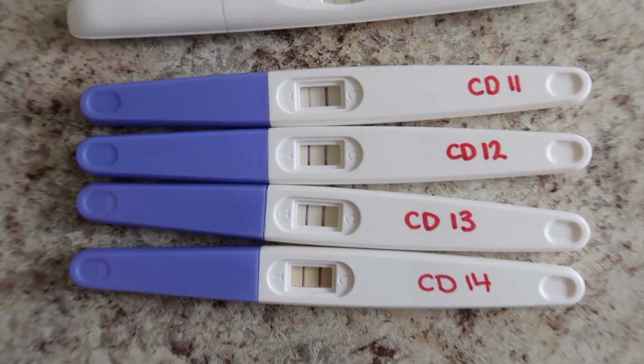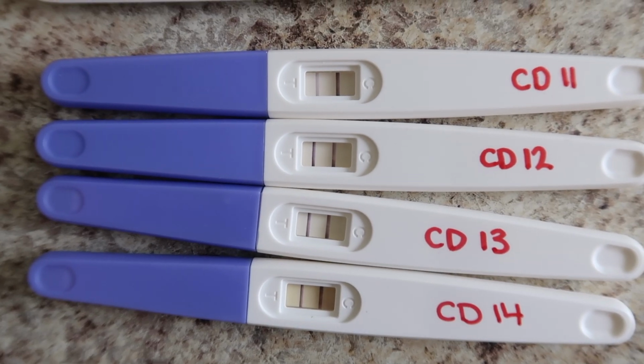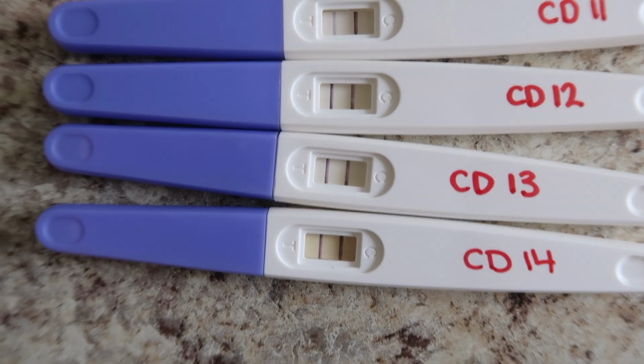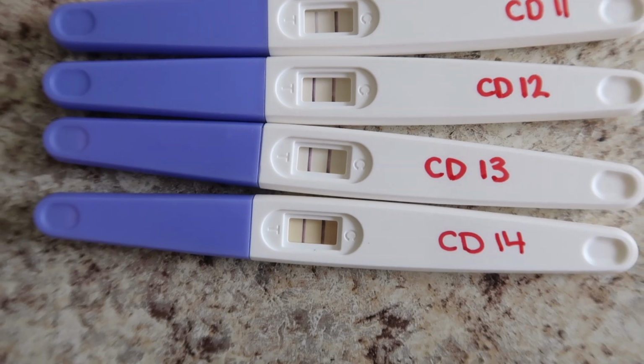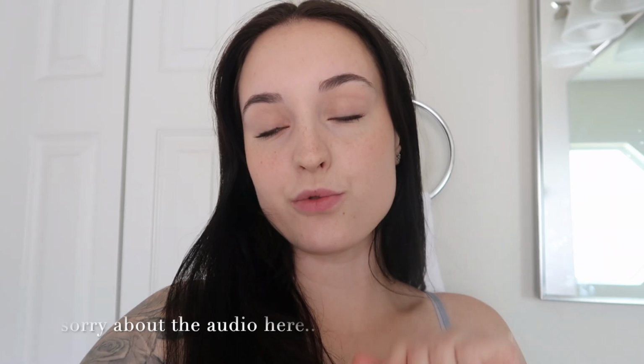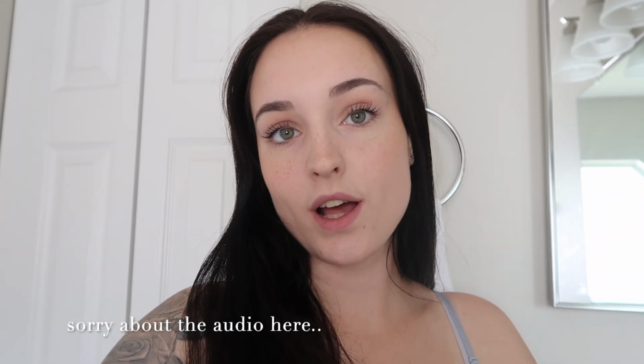Now moving on to the Walgreens, cycle day 11, that is a low reading. Cycle day 12 is a peak reading. Cycle day 13 high, and then cycle day 14 still looks high, but that was actually a low reading as soon as I took it. But that is how you read an ovulation test that has the two lines that come up.